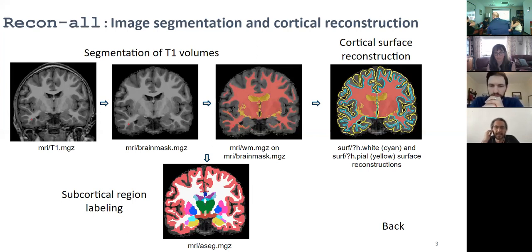So the cortex itself is a relatively uniform intensity. So segmentation's not going to do much because it's all the same. So then you go in and you do parcellation based on things that you do. Right.